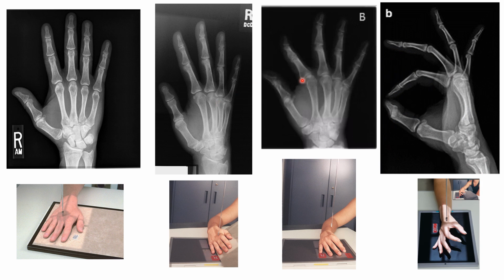In comparison, on the x-ray right next to it, we can see a little bit of overlap in the joint spaces. You see that opacity there where it gets a little bit more white and bright; that is where the joint spaces are overlapping. We have bone on bone instead of this nice clear black line that we can see on this image between the joint spaces. That would be nice open joint spaces, because the phalanges and the hand were kept nice and parallel to the table.